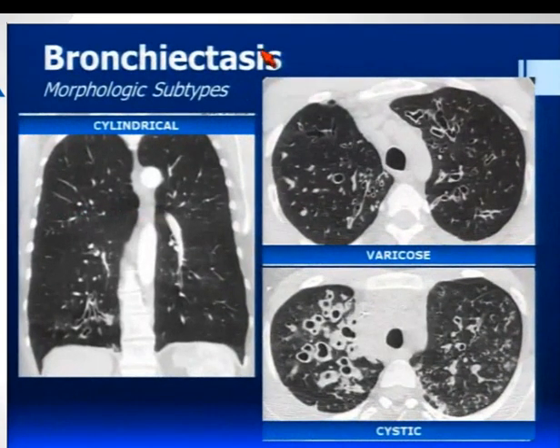You can have a stab at the severity of bronchiectasis because there is a kind of grading in terms of dilatation. Some airways will just be cylinders, and you might suggest that this is cylindrical bronchiectasis. And then as it gets more severe, you will see the so-called varicose type of bronchiectasis, where there is more significant dilatation. And then it starts to get into this kind of end-stage lung phase where you get really gross or cystic dilatation of the airways.